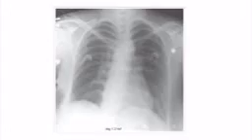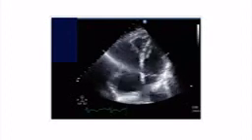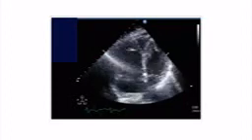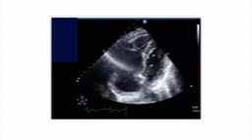The chest X-ray actually doesn't say a lot. Maybe there's a prominent pulmonary artery. Definitely, it doesn't seem as if there's an infiltrate or pneumonia present. Exactly. And this is her echo. So you can see she's tachycardic and her right ventricle is dilated. Function is also somehow reduced. And again, you can see the short axis.